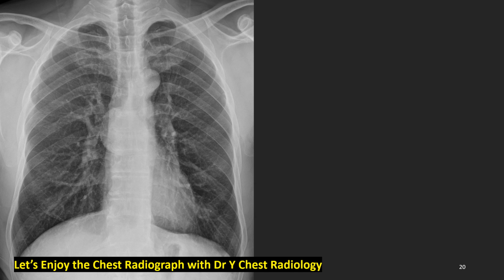Let's see the visceral compartment tumors. What do we see with this middle-aged man's chest PA film? Well-defined, obtuse angle, clear margin, broad-based, not in contact with right vertebral stripe, not in contact with right heart border, not in contact with right hilar pulmonary vessels. Where is it? Yes.